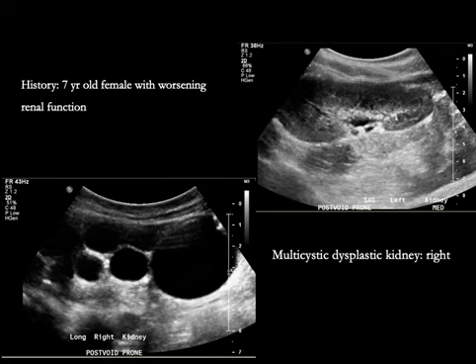So these are some of the common patterns that you will see on a MAG3 renal scan.